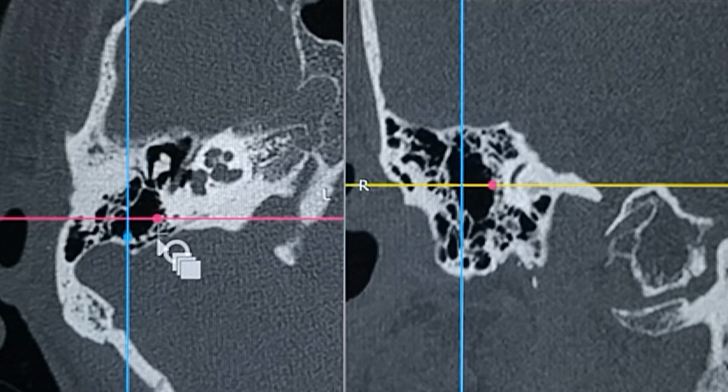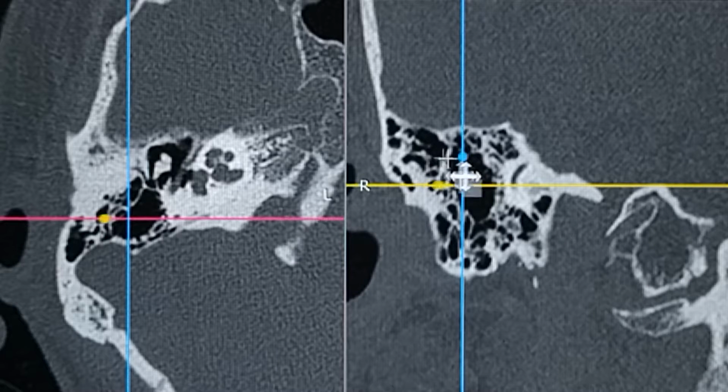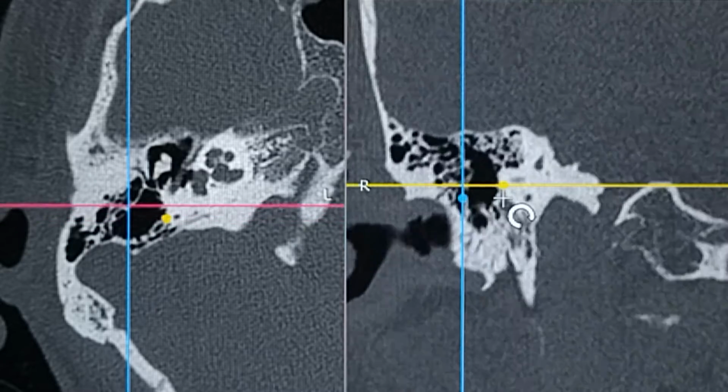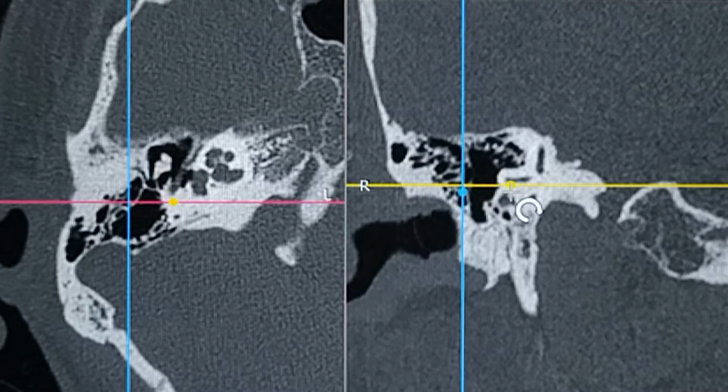That's the antrum. And when you come from here, you can see on the coronal scan, when you drill from here, this is a periantral air cell. You have to get rid of that. And then when you enter the antral air cell, the very structure which you can see over here is the lateral semicircular canal, the bulge of the lateral semicircular canal, which you can see right there.